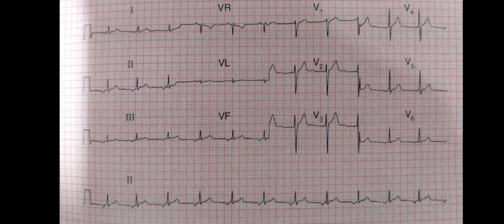Otherwise the ECG is normal, but you have to remember that whenever you find a P wave of this morphology, this is actually originating in the atrial muscle rather than the SA node, hence the abnormal P wave. And in this ECG you can also notice a slightly short PR interval, so here we can also comment in general that this is an abnormal P wave with slightly short PR interval, but the total assessment is that it is most probably an ectopic atrial rhythm.